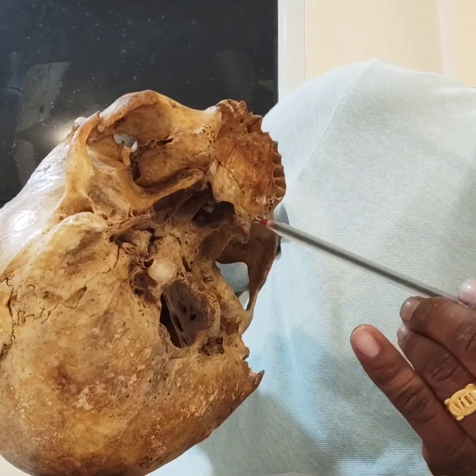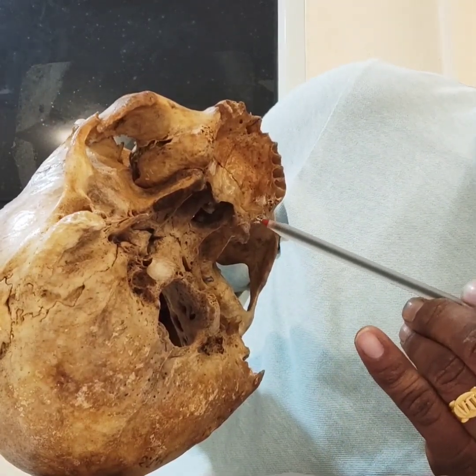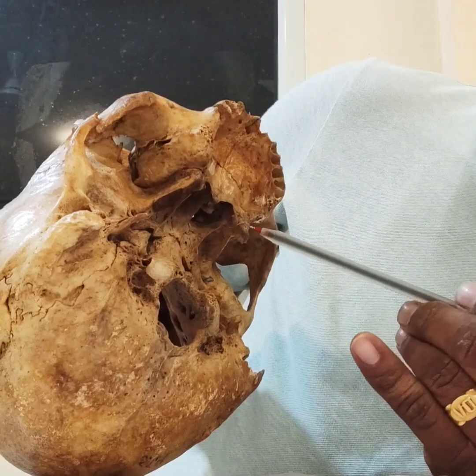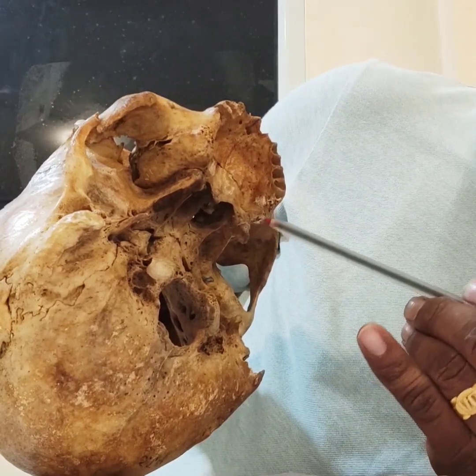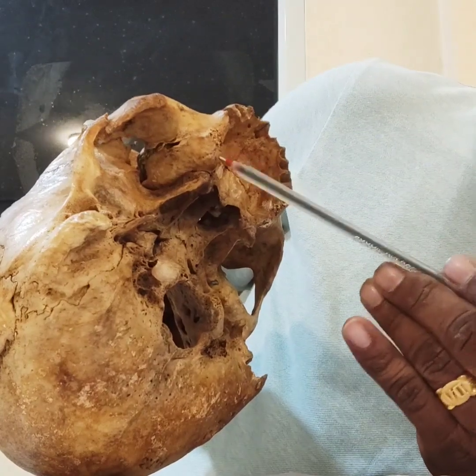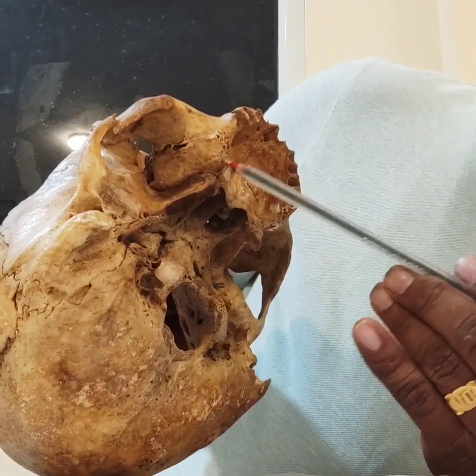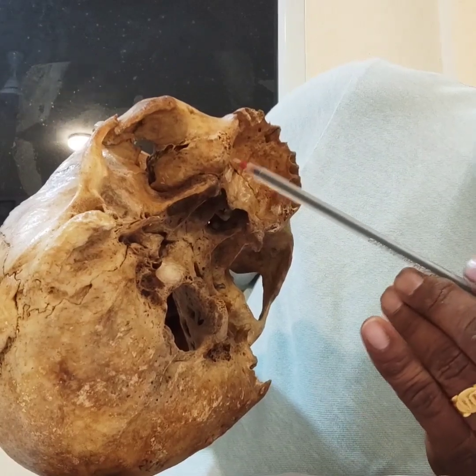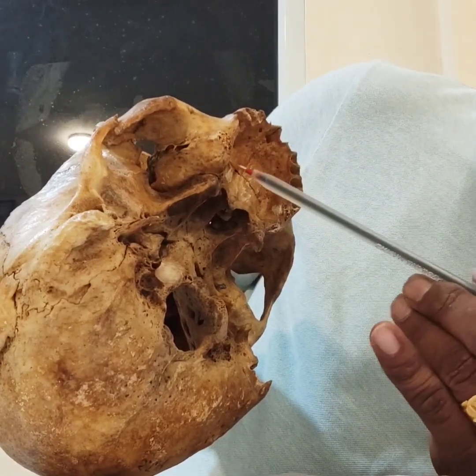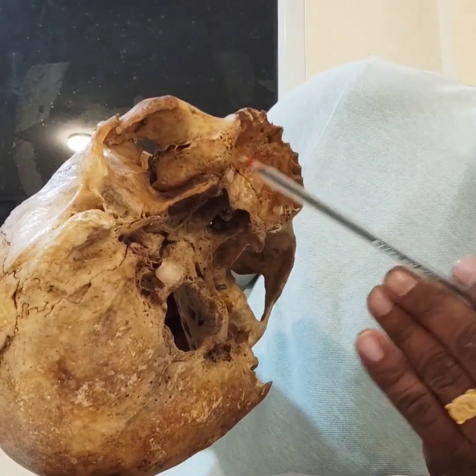So you can place two implants in the pterygoid region, that is the distal implant should be lengthier when compared to the mesial implant. You can place the double implants on both the sides, engaging through the tuberosity. Sometimes we call them tuberopterygoid implants. Sometimes we place the implant traversing the posterior wall of the maxillary sinus also. So there are three different steps in this one.